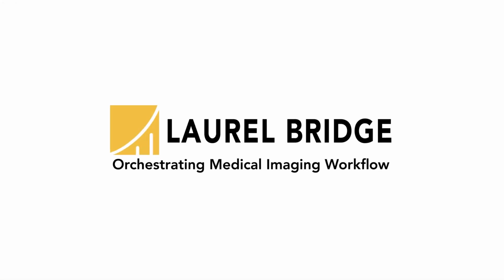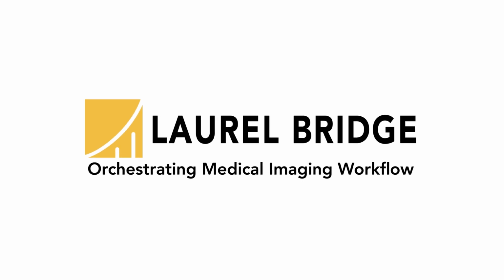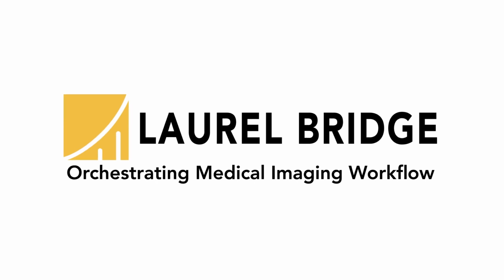You have also seen how the Laurel Bridge Compass Workflow Manager serves as the AI orchestrator by connecting modalities, PACS, 3 different AI models, AI viewers, and reporting systems. In our example scenario, Compass routed studies and reports intelligently to the appropriate destinations. It was also able to ensure interoperability by converting results from DICOM to HL7. This was done following various industry standards, including the IHE AI Trial Implementation Standards that were mentioned earlier in the introduction.